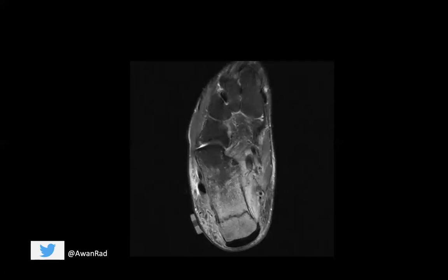And this is just an axial image through the calcaneus, again, showing the fracture, again, is perpendicular to the long axis of the calcaneus. So, next time you see an area of linear sclerosis running along the calcaneal tuberosity or posteriorly, it runs perpendicular to the long axis of the calcaneus. It's nothing else but a stress fracture. Okay, and this is how all calcaneal stress fractures look.